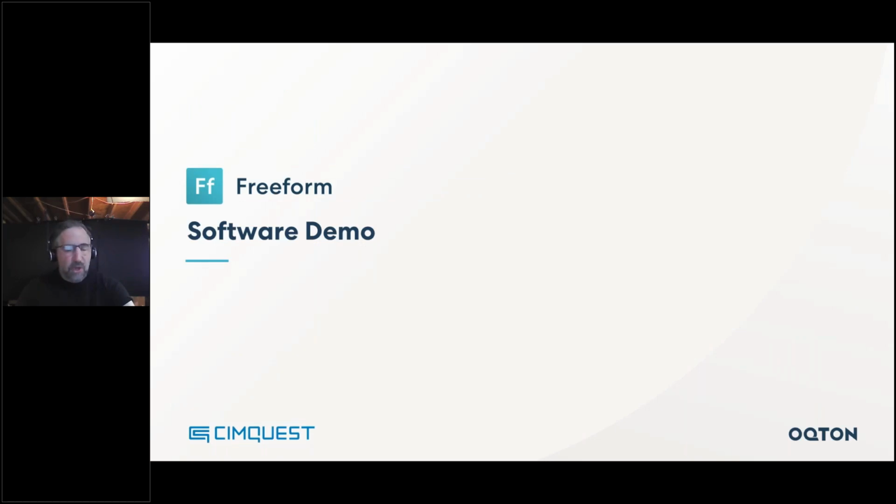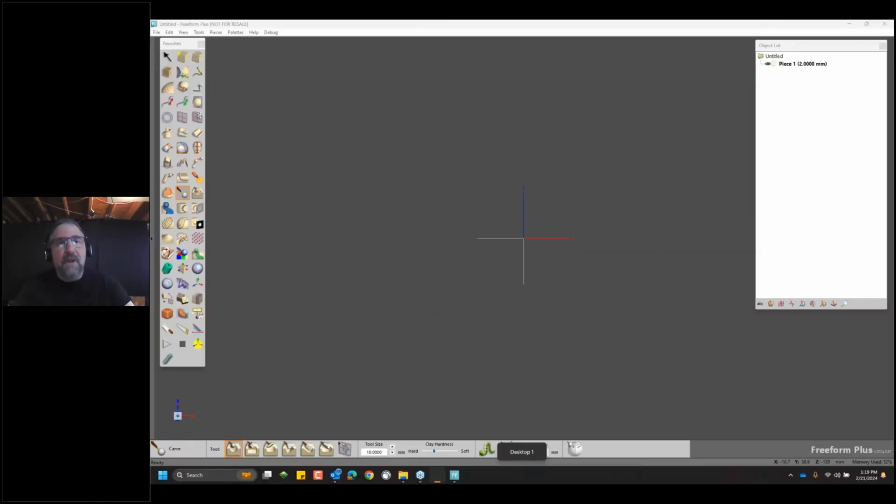Now I'm going to jump straight into the CMF guide. But first, I will also turn on my webcam so you can see the haptic device in action.